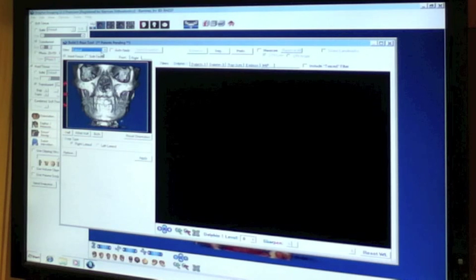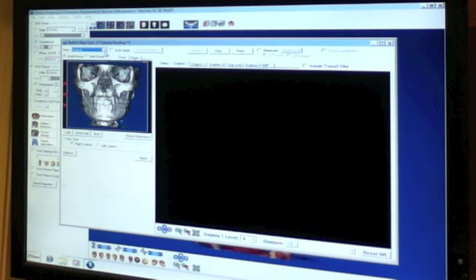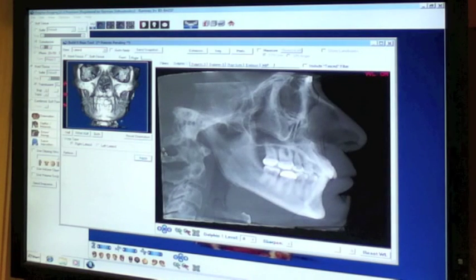You'll start with your lateral view. If you look up at the top, I'll show you which you're looking at. You'll want to keep it set to right lateral, and all you need to do is hit Apply. Adjust the sharpness and the Dolphin level to your doctor's preference. Sharpen is the slide bar and Dolphin level is the drop down right here.